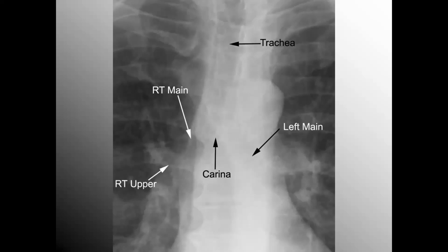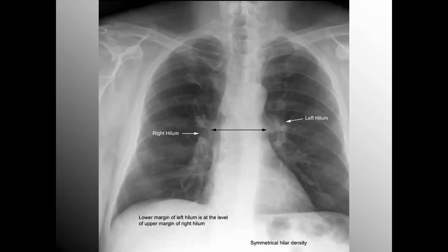Now notice in this slightly zoomed in image, the clavicular heads. And of course, all the structures denoted are labeled, but just recalibrating our perspective before we begin to practice chest x-ray interpretation, you need to know where these are located. So looking at it here, case in point, you've got the clavicular heads, which look aligned in the same plane.